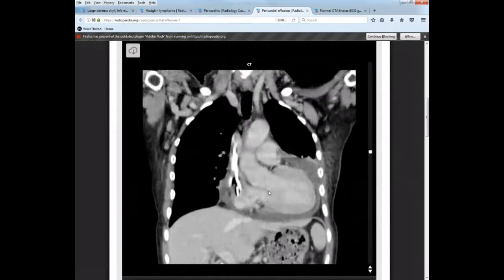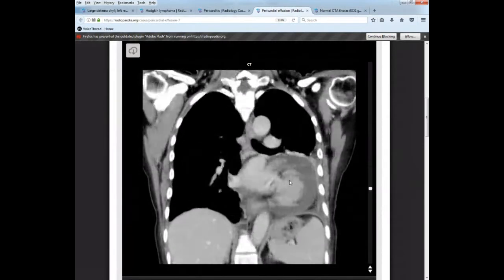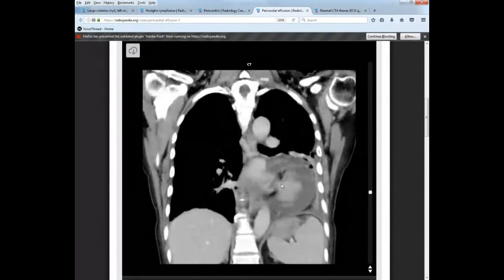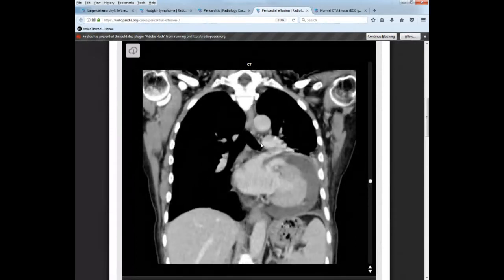In some studies where it's really good, this is the resolution, and this is kind of off. But if you have a really good ECG gated CTA, or rather a regular study, you can see where the atrium and the ventricle meet at the tricuspid and the bicuspid valves, you can see that papillary muscle, but we're not seeing it here. So don't worry about it. Sometimes you can, sometimes you can't.